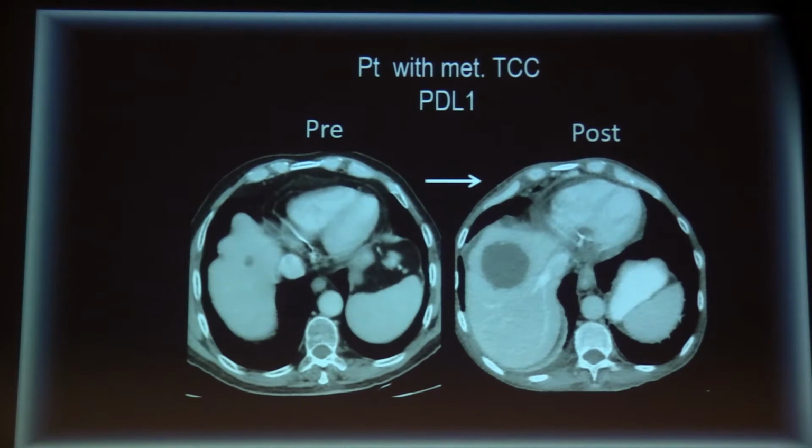This is a patient who has metastatic TCC. He has this cystic lesion in his liver and received immunotherapy. Now, he comes in a few weeks later following the treatment, and we do the CT, and this cyst enlarges. The enlargement of this lesion doesn't mean progression. It actually means regression. The attenuation decreased by 15%, and according to criteria, there is regression here.